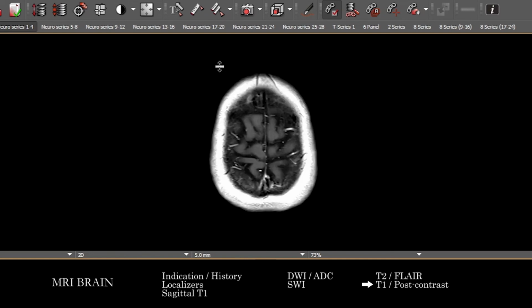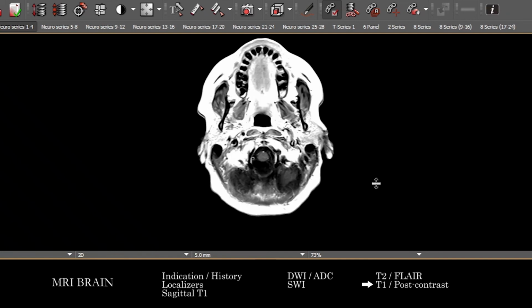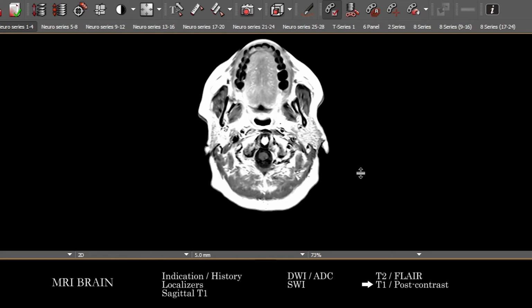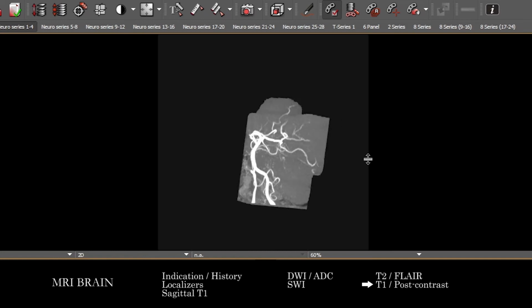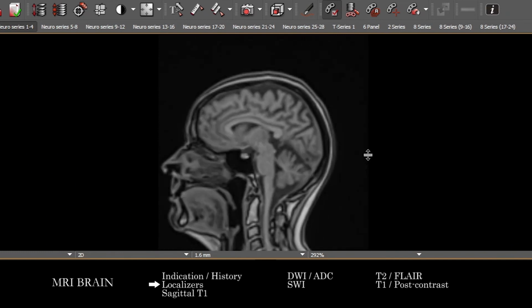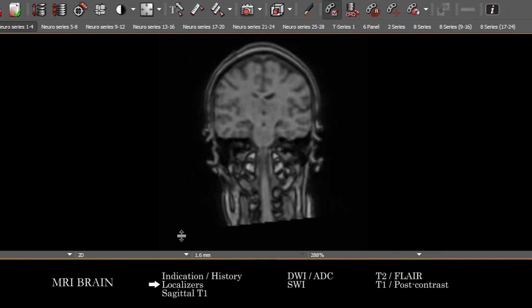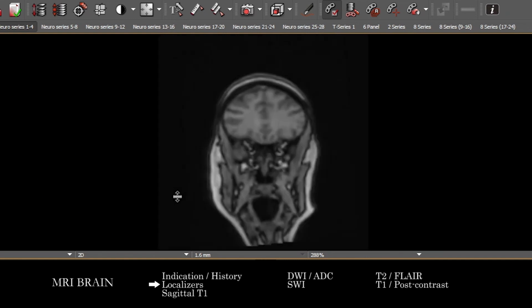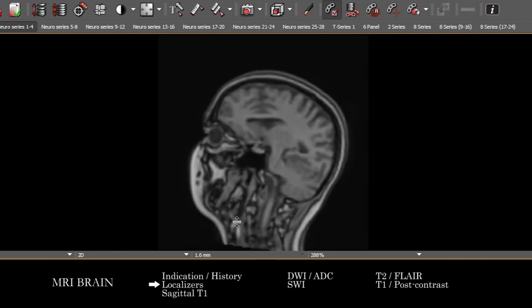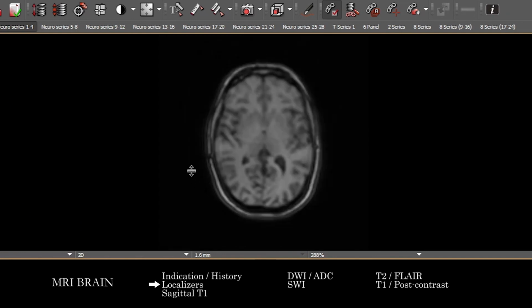So, similarly, we're going to do a full search pattern through the anatomy, which I'll leave the details as I covered, extracranial, intracranial, and then through the brain parenchyma. Okay, we'll go over the MRI images, and then we have localizer images here, and you'll notice sometimes you see a little bit more of the upper neck than seen on the remaining sequences. But we go through these quickly to make sure that we don't miss parts of anatomy that we don't see on other sequences, such as some sort of serious mass lesion or severe stenoses or other pathology in the upper neck.